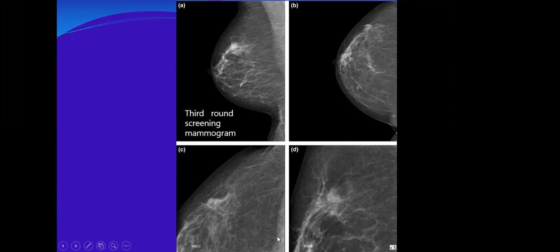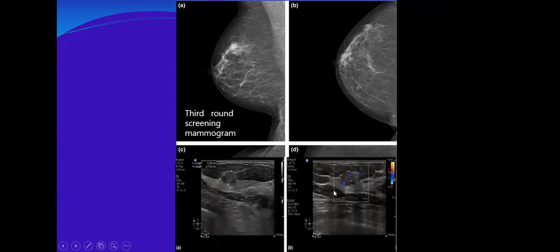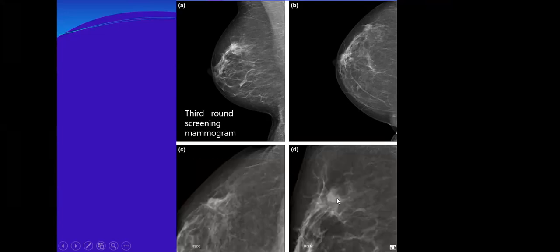I brought for you the spot compression at the same moment, and I kept it from you. I present for you the standard as well as the spot compression at the same moment. I could not well appreciate it. It might have become denser, but the conspicuity of a mass is not very good. Here in this view it might give some impression of being more focalized.